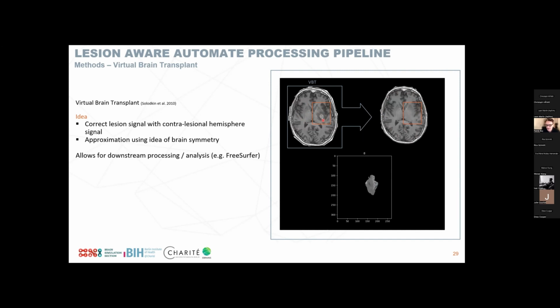For example, FreeSurfer, if we want to extract the surface, we've talked about this before, right? We're trying to map this triangular mesh onto the outside of the brain, and that is always just defined by the intensity values that we find, right? Outside of the brain is basically black, CSF.